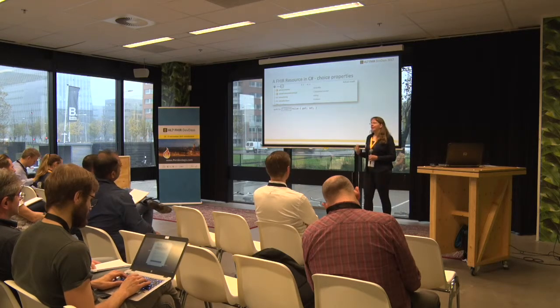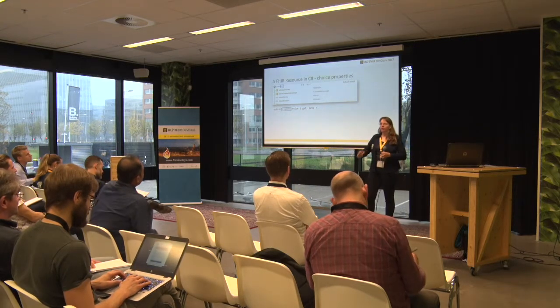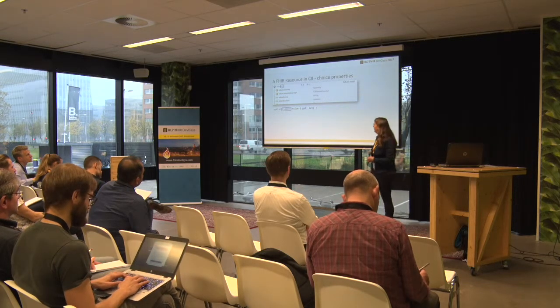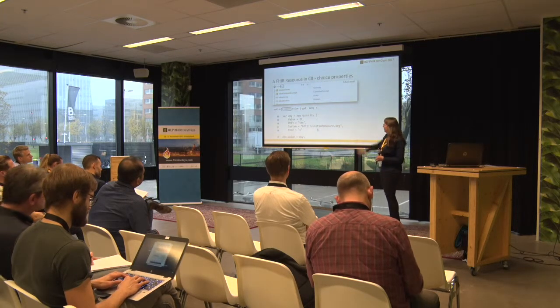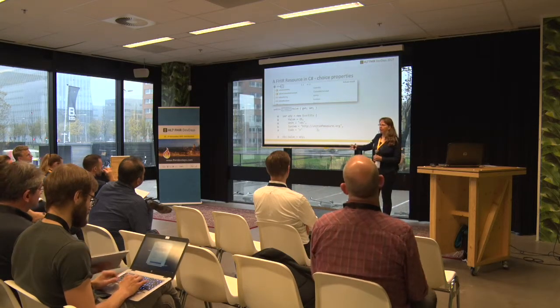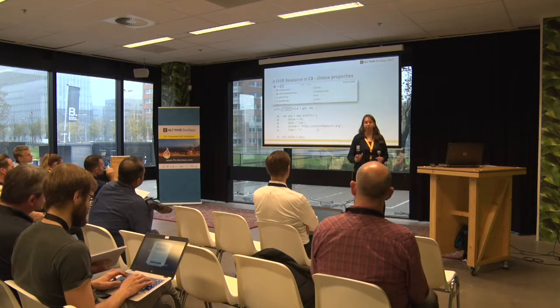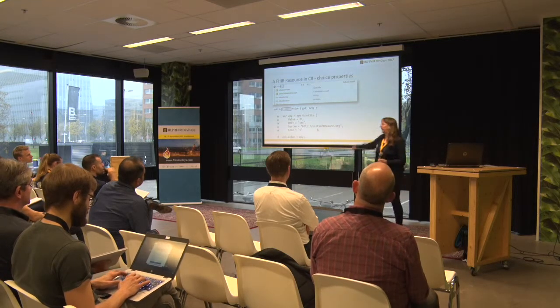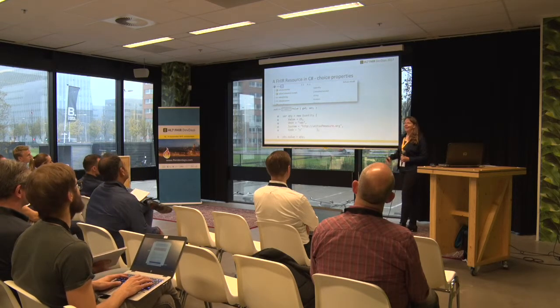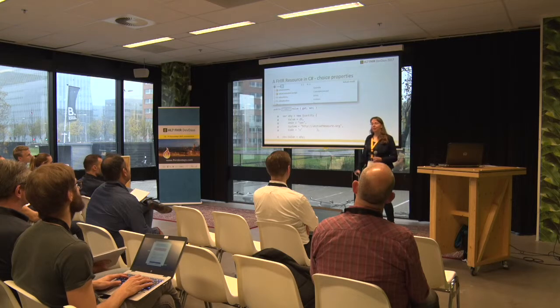What this also means is that you will have to first create a FHIR type, and then you'll be able to fill it in inside of this value. So for example, I can create a new quantity, fill in some values for the quantity, and then I can set the observation value to that quantity. I could also have chosen a string. I create a new FHIR string and put that inside of my observation value. So you first make the choice, create that FHIR data type, fill it in with the value you want, and then you can fill in the field inside of your resource.